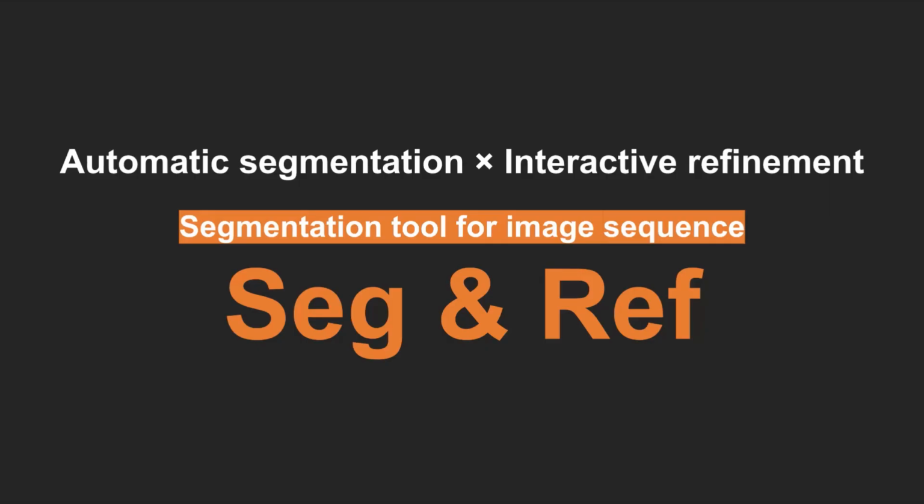We have introduced SegRef, a segmentation tool for image sequences that combines automatic segmentation and interactive refinement functions. As an example of a workflow, we have shown the process of creating a 3D model from histological sections, but SegRef is a highly versatile tool, so it can be used not only with histological sections, but also with various types of image sequences, such as CT, MRI, and ultrasound images.